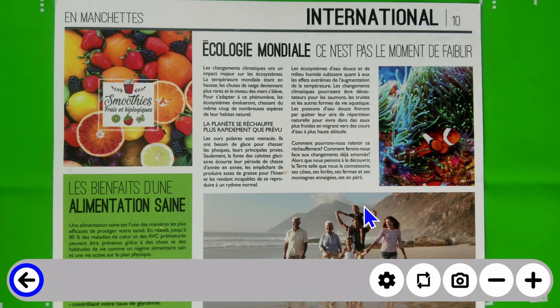So that is a quick overview of all of the settings that are available to you when you're in live magnification. Again, tune back in for those videos that go more in depth into capturing documents. We will do single documents like we're seeing now and go through those settings. And we will also take a look at multi-capture mode in those other videos.